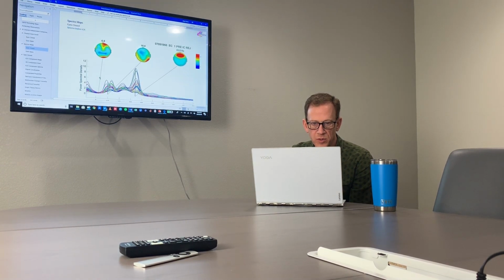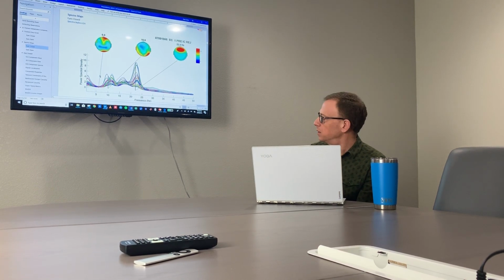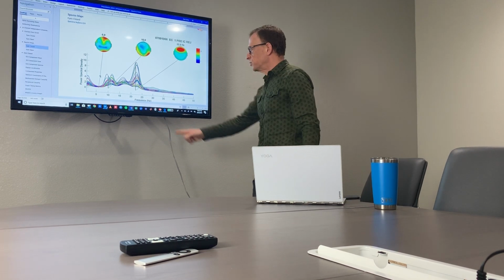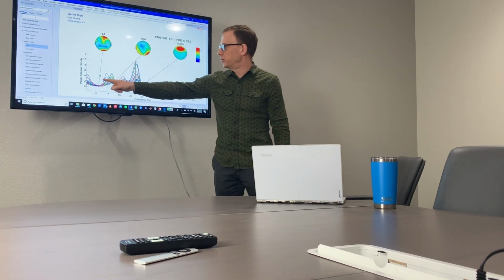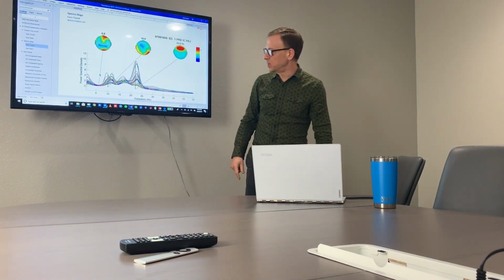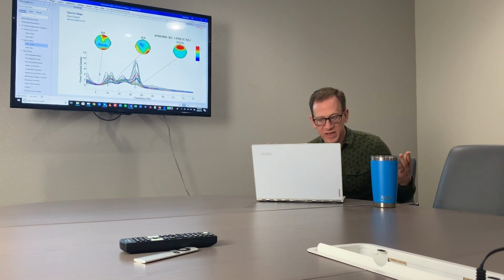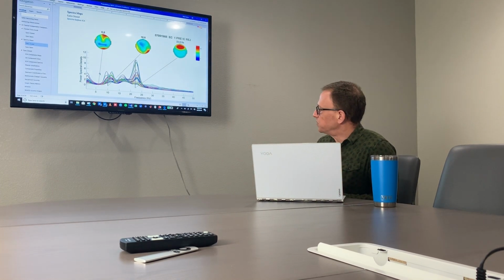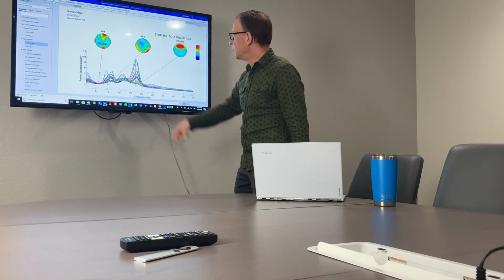And you'll notice, for example, this is the spectral plot of the EEG that shows the frequency across the bottom from 0 to 50 hertz and power spectral density on the side, which is essentially amplitude or the size of the waves. And it shows us peaks and valleys in alpha, beta, and higher beta as well.